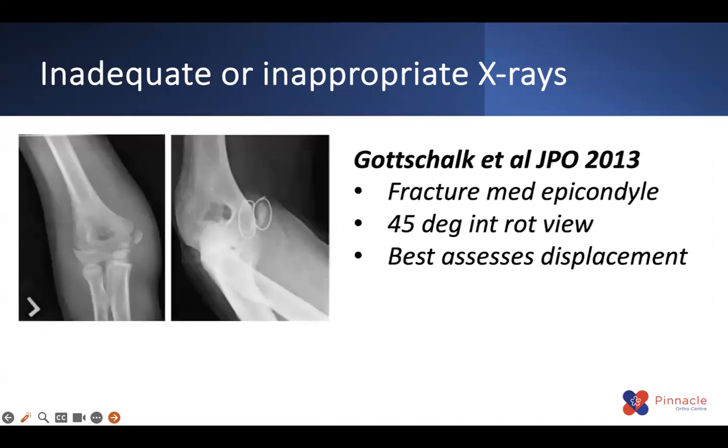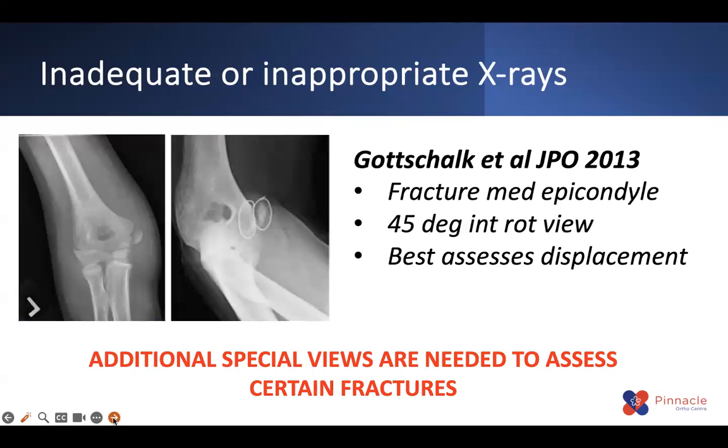The same applies to medial epicondyle fractures as well. In medial epicondyle fractures also, the fracture displacement is best assessed on the internal oblique views. Therefore, in special fractures, you have to be aware that additional special views are needed in order to assess the fracture displacement, and this can have a large bearing on your treatment protocol.